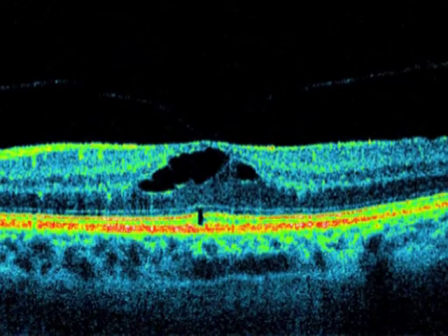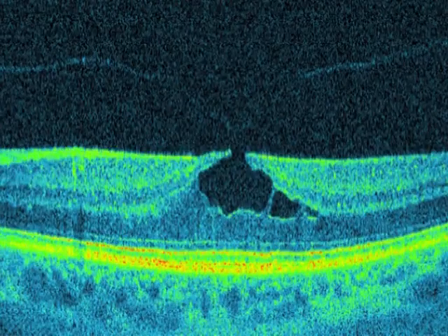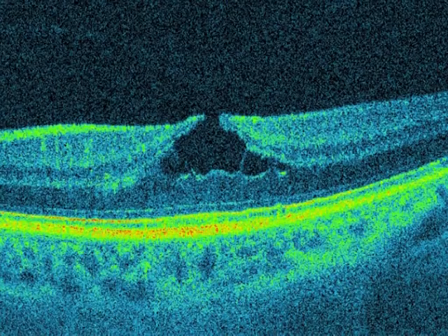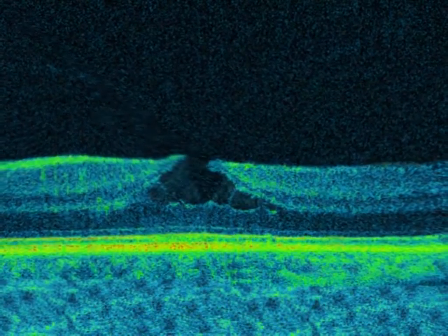Focal traction is a very probable cause of the primary appearance of retinal defect. Release of traction also causes slight defects, probably focal removal of ILM on the surface of the retina. Then, interretinal changes may develop together with epiretinal membrane formation. This animation presents lamellar macular hole formation and healing after surgery.